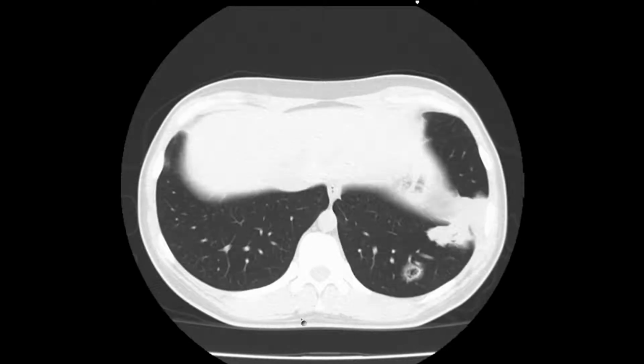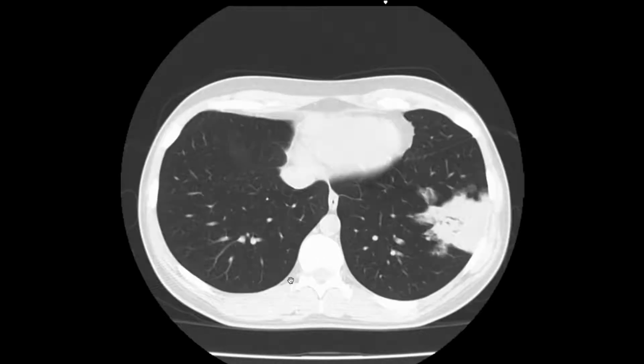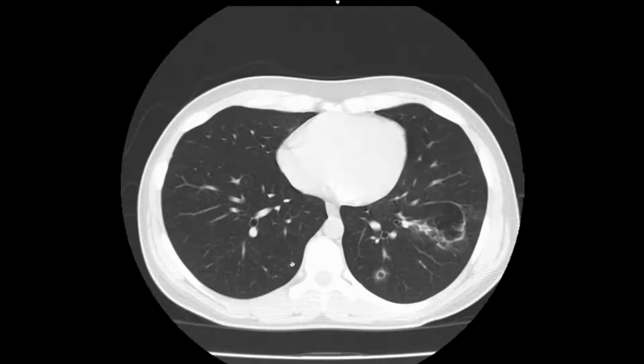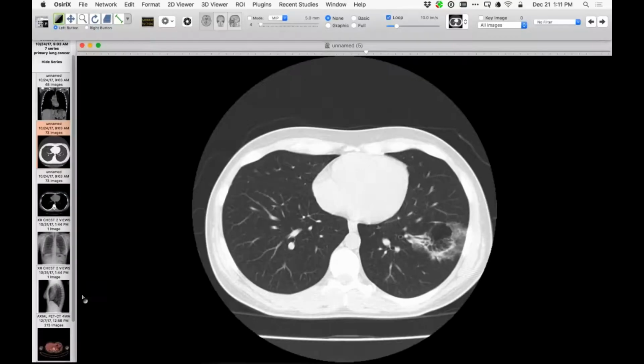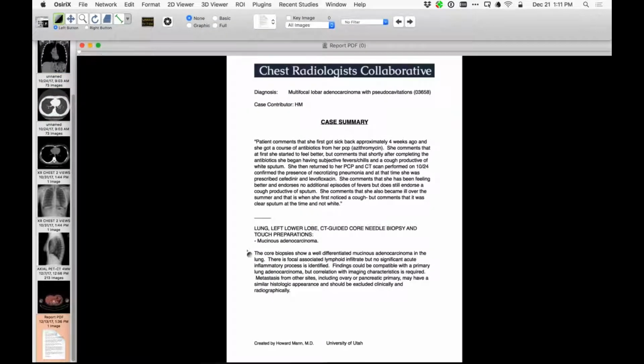So Howard, I have a case. I think I have it loaded up. Yeah, I have one we just saw that has the more exuberant airway spread of tumor and the little like Cheerios with the little cystic nodules. But I'll show one a little bit later that shows even more. Yeah, and I'm trying to remember in terms of airway spread. I think this one was described as mucinous. So that may be another reason how it spreads. It does say mucinous adenocarcinoma on that biopsy report, as you see there. So perhaps the mucin carries the cells and then they grow in different places, right? Presumably.